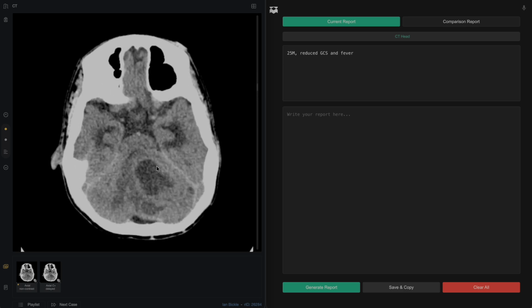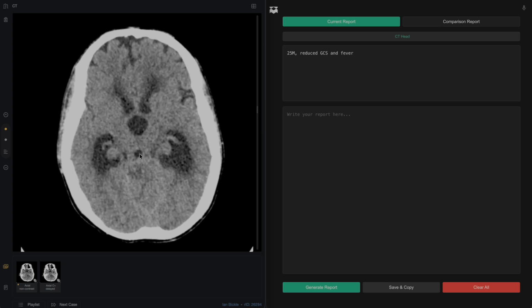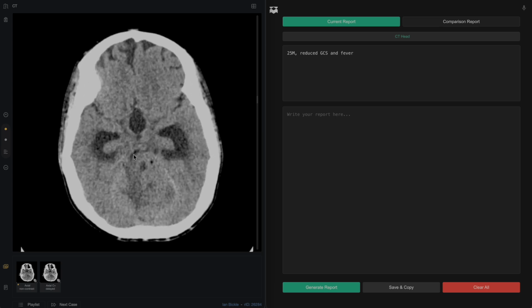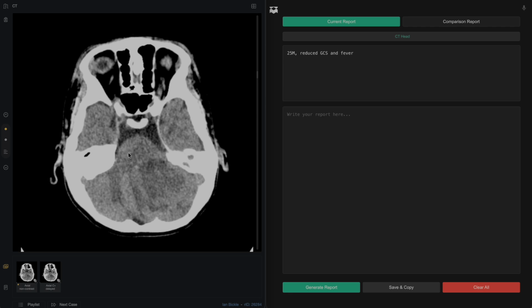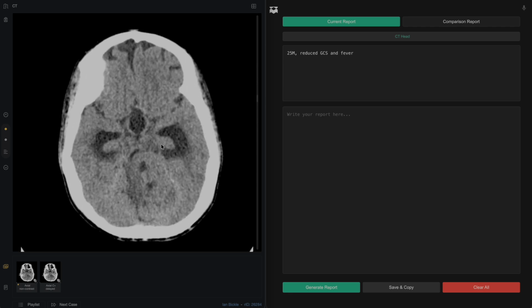We can see that this lesion is completely effacing the fourth ventricle. As we travel down through the distended cerebral aqueduct and come down to the fourth ventricle, we see first it's effaced down to a sliver, and then as we go further down, it's completely closed shut, which explains the hydrocephalus that we have seen upstream of this.